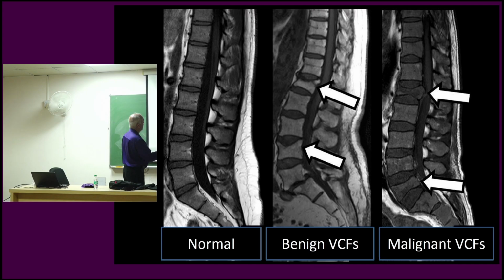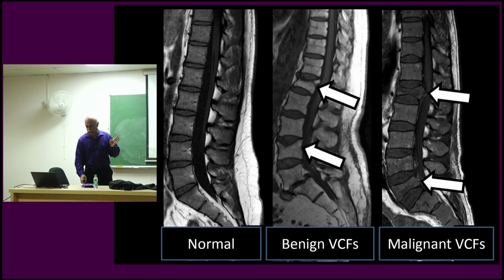Compare also the signal intensity. The signal is low here compared to this, compared to that. Unfortunately, in MRI, the actual T1 values are not retained and given to you in the output like Hounsfield units. You just get a JPEG or TIFF image. Normalized pixel values 0 to 255, and you only can do relative analysis. I asked about it, they said, well, it's not there. It's called T1 weighted, T2 weighted image. I don't know why they can't provide actual values.